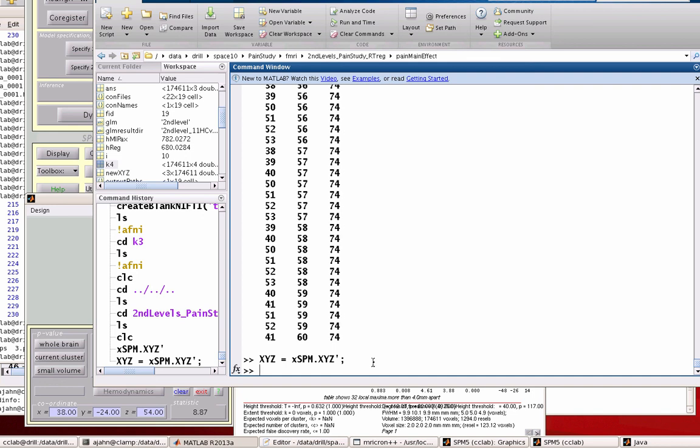I'm also going to run the k-means analysis on a bunch of the regressors. I'm going to be looking at all the regressors and have a value for each regressor in each voxel. So if you remember, there's spm_getData, and within each of these second level analyses, you create, say, one contrast, and you will have the ability to extract data from each individual voxel for that particular contrast. So in this folder, there's only one contrast.